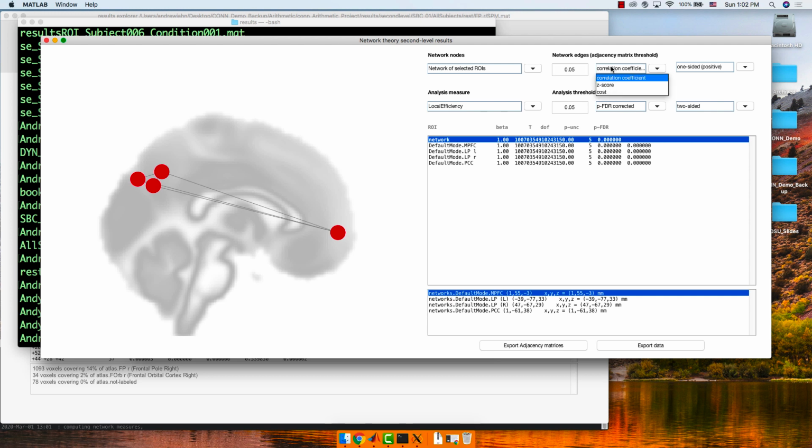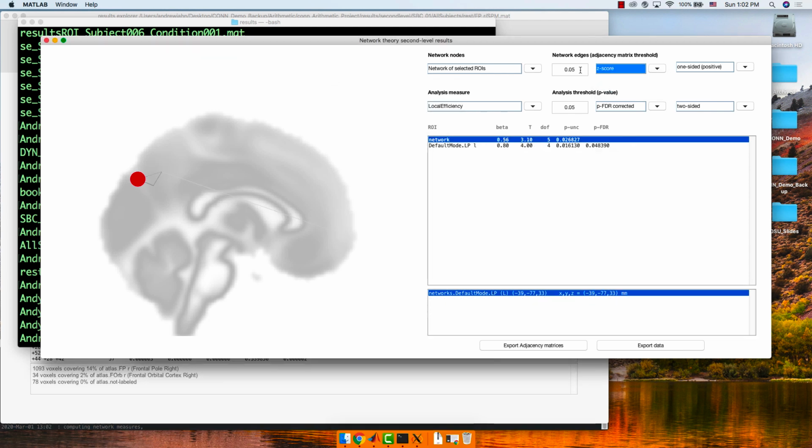What would make most sense from my perspective is to use the z-score threshold, right? And in that case, it's really going to bottom out because we don't have a lot of power for this particular analysis. But in general, if you had this at, say, something like 1.96, which is a pretty typical threshold, notice that nothing survives correction at this particular level, right?